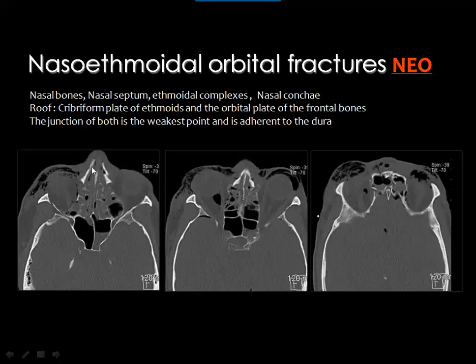the trauma to the face is central, while in cases of zygomatico-maxillary complex fracture, the trauma is off the midline towards the site injured. Then here you see comminution of the nasal bones and the comminution of the ethmoidal air cells, as well as comminution of the frontal sinuses, including the medial orbital wall.